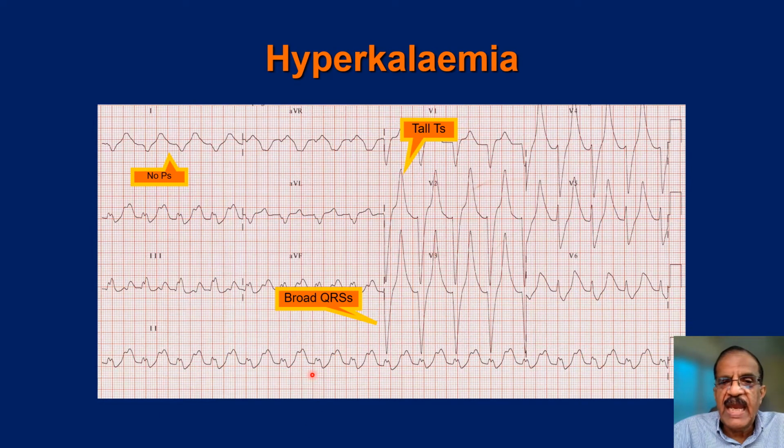So this is a case of hyperkalaemia. I think this ECG in itself is fairly diagnostic. Anybody who has experience would not miss this abnormality. All classical features, but it should be particularly easy if you are already dealing with somebody who is likely to have hyperkalemia, like renal failure or many other conditions. I'm not going to go into the details.